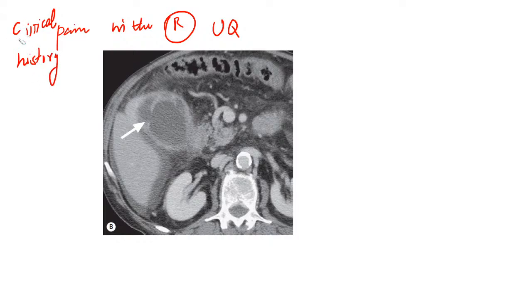So what is your diagnosis for this case? A patient presented with pain in the right upper quadrant.